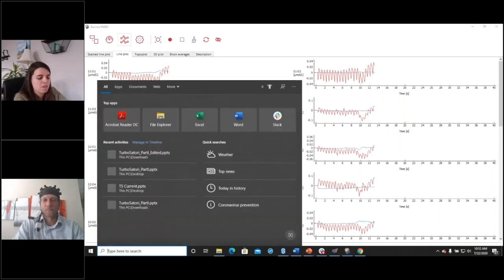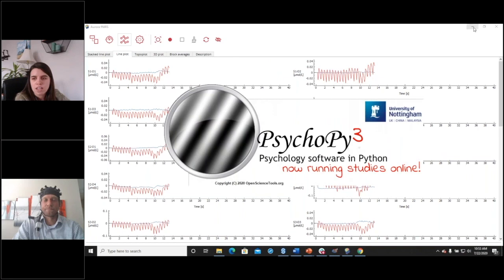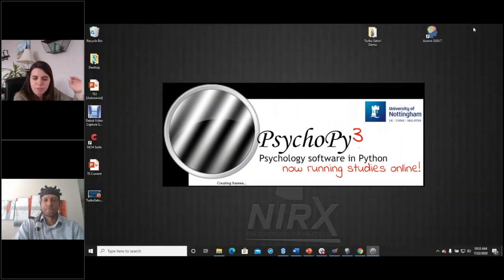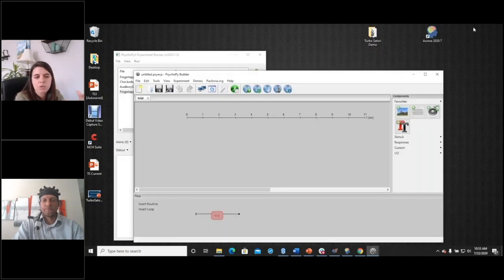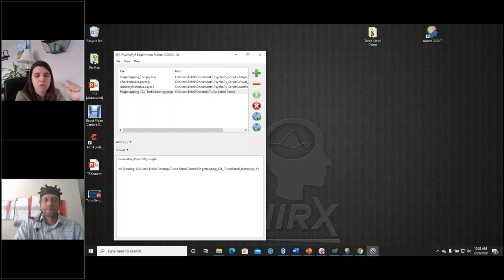I'm going to open up the paradigm. So we are using PsychoPy for this paradigm, and we'll see that loaded up in a second here. There is a specific order we'll need to start this recording with. First, we need to open up the LSL stream in PsychoPy. PsychoPy is using the LSL stream to send triggers, and we need to first get this stream open for Aurora to find it before we hit record.